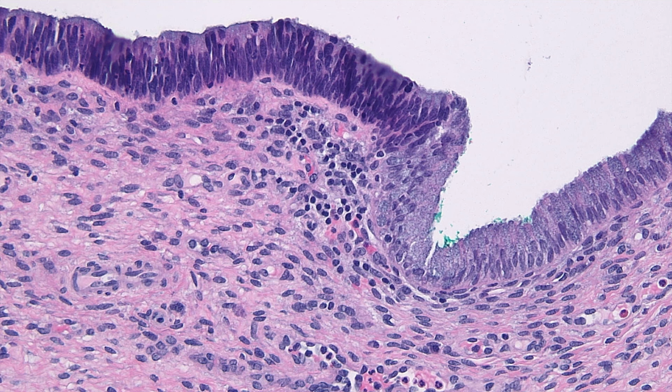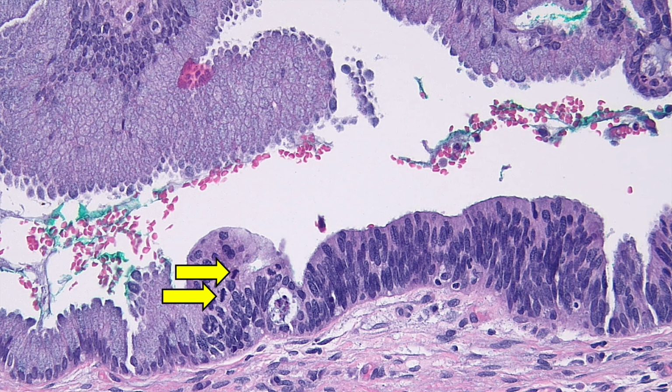And the cardinal cytologic features include pseudostratification, which is easy to see on this one. Another helpful feature of adenocarcinoma in situ, at least in my mind, is that it stops and starts. So you can see on the right-hand portion of the screen, the more normal appearing glandular endocervical cells, and it abruptly transitions to the dysplastic epithelium. That's a common thing I find with AIS.